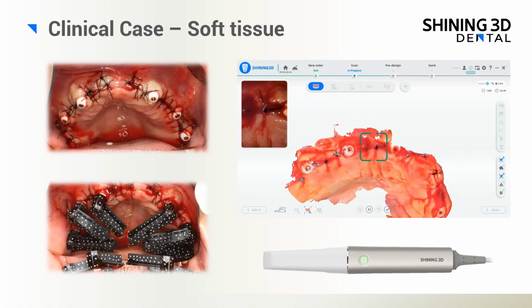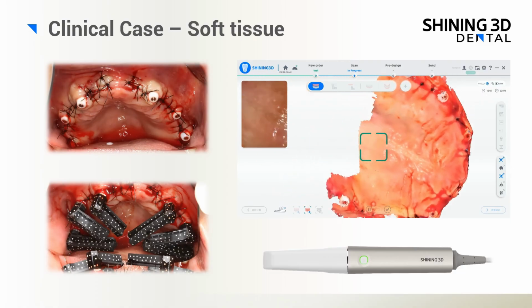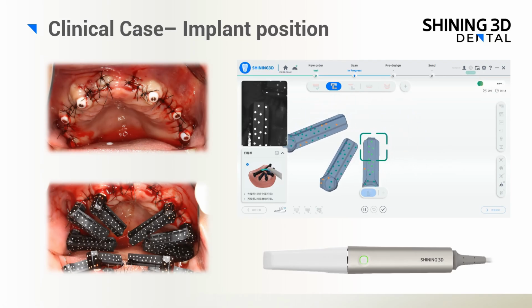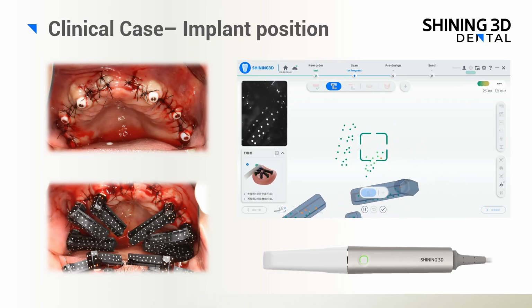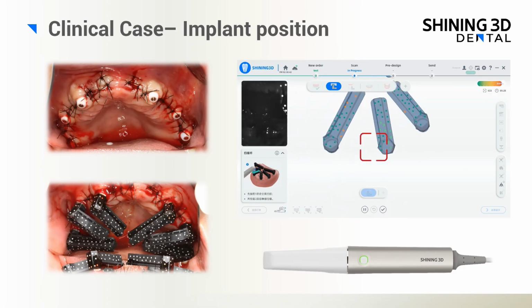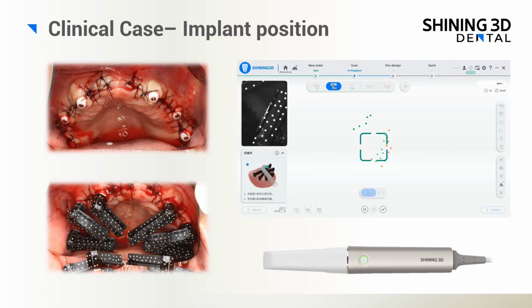the multi-unit abutments. The known limitation of intraoral scanners is their relative inaccuracy for multiple implant positions in full arch implant restorations. Aoralscan Elite uses intraoral photogrammetry technology, completely eliminating interference from mobile soft tissue even in immediate loading cases with open flap surgery. The process identifies only the coded markers without relying on scan body geometry data. The software processes thousands of photos collectively, achieving global optimization with precision within 5 microns to ensure a perfect fit for the restoration.